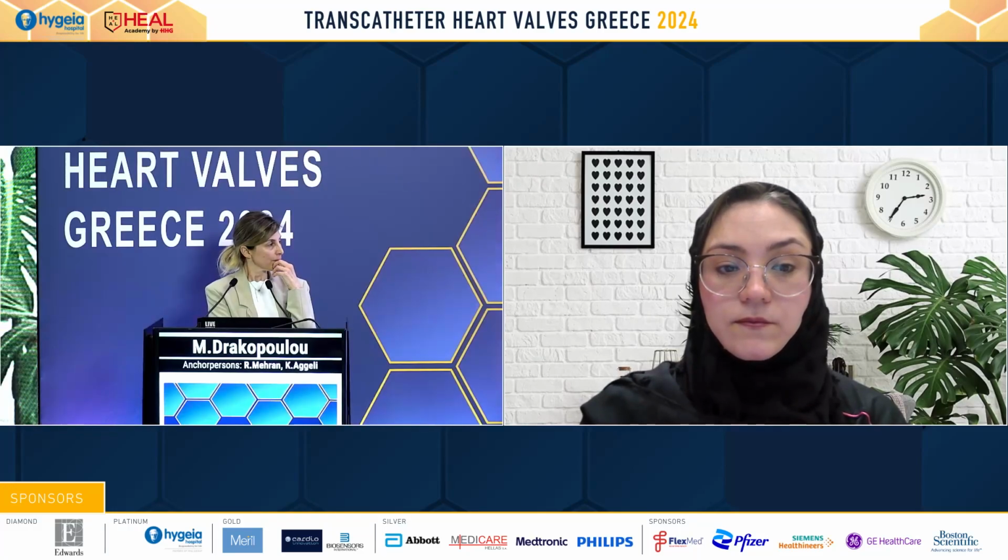Yeah, that's a good comment. And I also wanted to extract from congenital patients that sometimes in our everyday practice, the subcostal views might give us, in some patients, a very good idea of the tricuspid valve anatomy. Not all adults obviously have clear subcostal views, but as you are there doing the IVC and seeing what the IVC is doing on inspiration, etc., if you do the subcostal short axis, you will get a view like the transgastric view that you showed very beautifully.